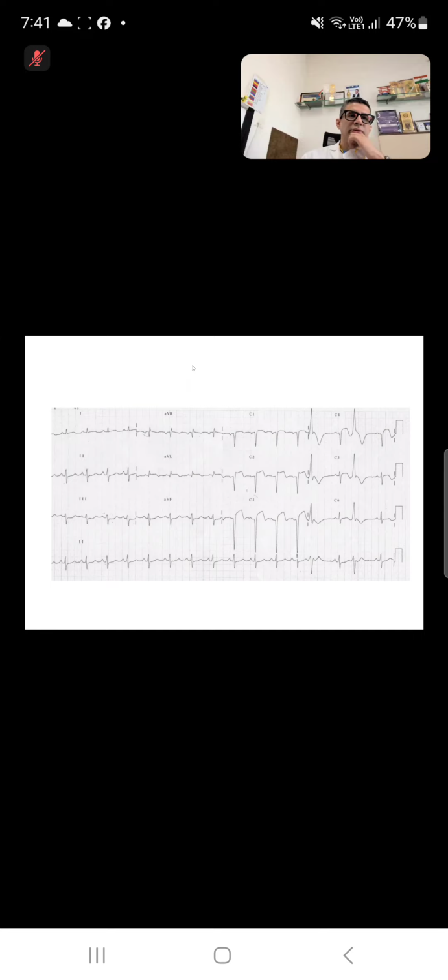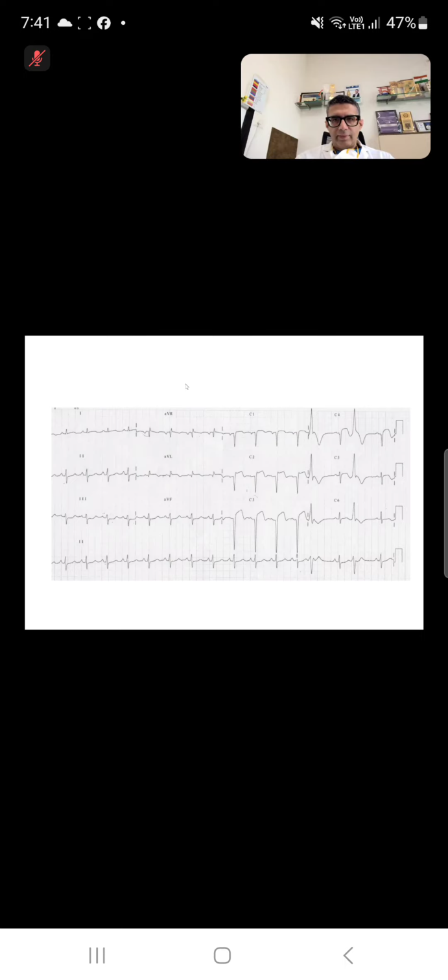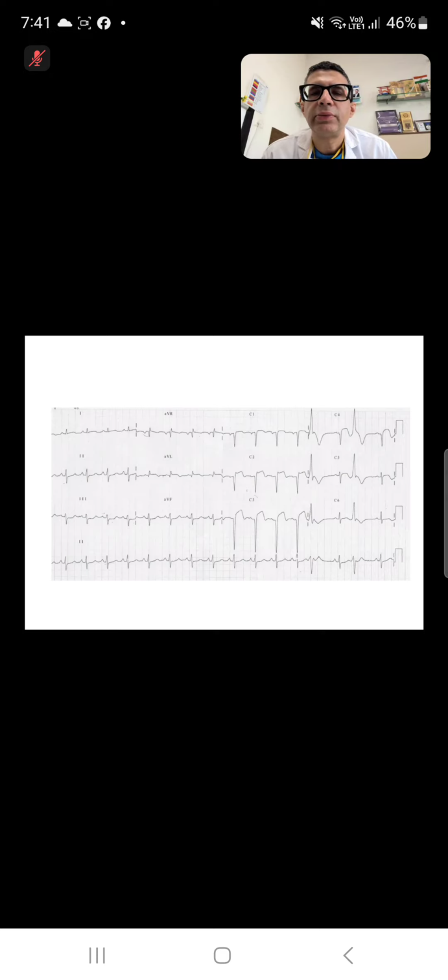Coming to QRS complexes, sir, there is ST elevation in... No, for QRS, you don't talk about ST elevation. You talk only about the QRS. Normal QRS, sir. No broadening, no deep S waves in V1. Is it an S wave or is it a Q wave? It is S only, sir. Small R can be seen. Where are you able to see R? There is no R wave.